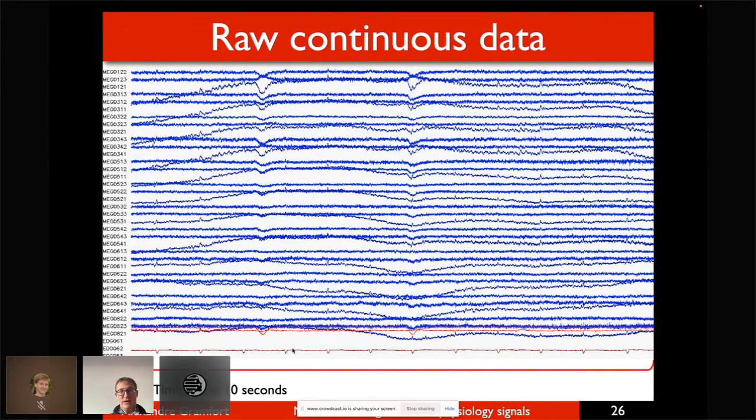of artifact. So usually in a class, I would ask you to tell me what you see. Here, I don't really see you, so I will assume that you are trying to do what I'm about to ask you, which is, okay, just looking at this signal, what do you effectively see, and what types of problem do you foresee by eyeballing this data?